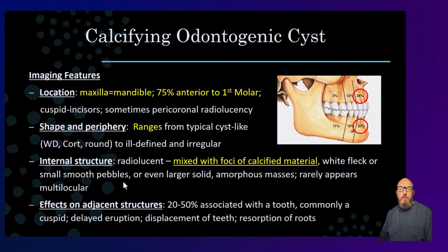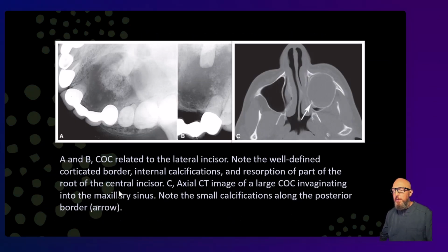And so what's the big thing for this? This is the bimodal one. It's a somewhat rare tumor, but maybe you get a young patient in the anterior, you'll have this as well as AOT, especially if it's a female, or if it's an older patient in the anterior, something that causes calcification. So here are a few examples of that.